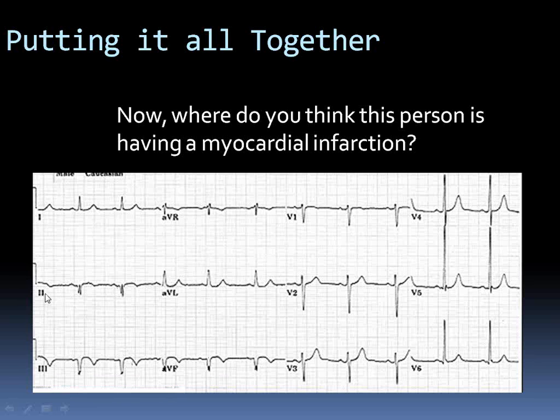And there's very slight ST elevation in lead 2. So these are the 3 leads that are showing slight ST elevations. But you guys are right, it's not very clear.